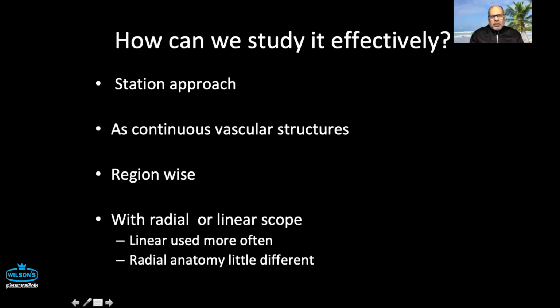So how can we study it effectively? In the case of mediastinum, it is a station approach, or you can actually trace the vessels region-wise. So we're going to discuss only the linear scope here because that's practical. Most of the units have the linear scope. Not many are using the radial scope. And so it depends really where you are taught, how you are taught, who is teaching you, what books you're looking at. And all of these approaches are okay as long as they work for you.